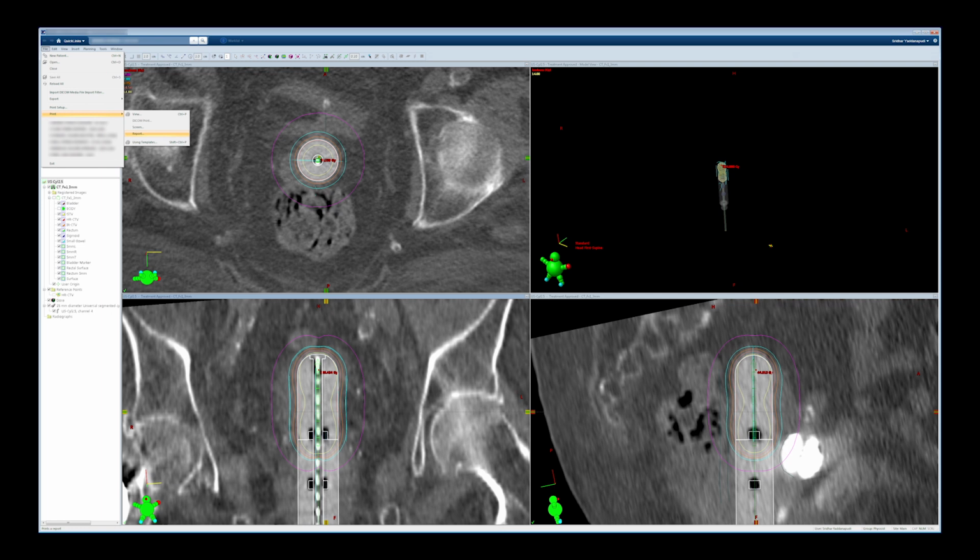For our institution, we have a Mosaic record and verify system, and a lot of the entry that goes into the Mosaic is just for manual tracking purposes, so in case we have to do any queries, we can get that information.